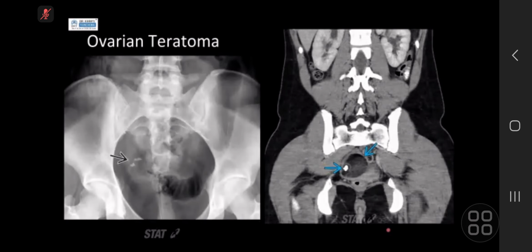Just going on a bit more, just because this did come up for me in the exams, I said earlier, and it shows you that there's some tooth-like calcification within there. And on ultrasound, on MRI, it shows you nicely an ovarian lesion with foci of calcification. CT, actually, apologies, CT showing you calcified with low density, so probably a mixed solid cystic lesion in there, or probably even areas of fatty components where the areas are more hypodense.